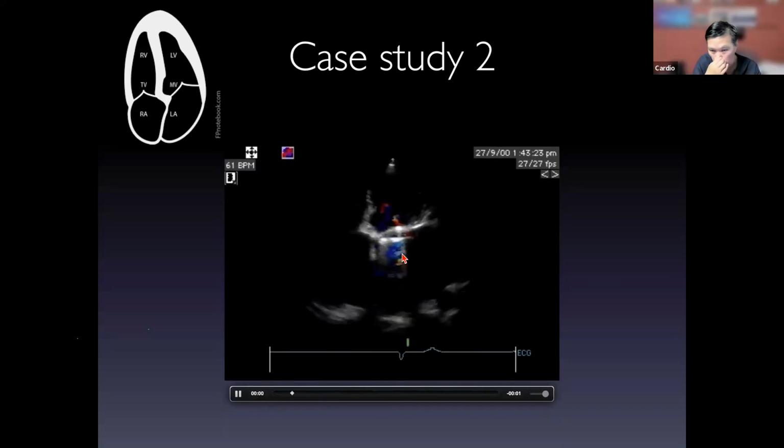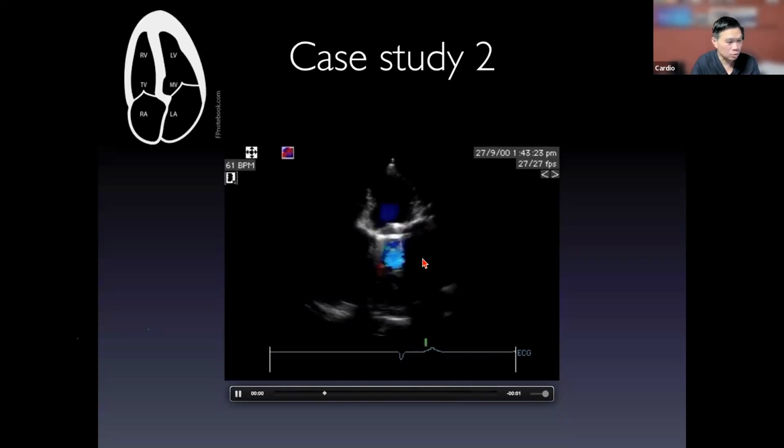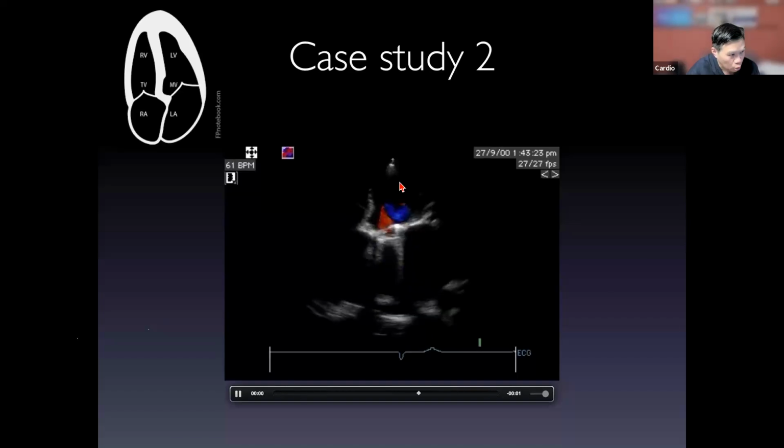What is really fascinating is that you have the left ventricle during systole, and there's a color Doppler here, right? So what do you think, is this real? In your mind, you will know this is what we call the dark side of the moon, because during systole the mechanical mitral leaflet will be closed. So you shouldn't be able to see beyond the mitral leaflets, and you can see these reverberation artifacts, or what we call comet tail, that keep coming down because you just keep reverberating here. But what is this color thing?